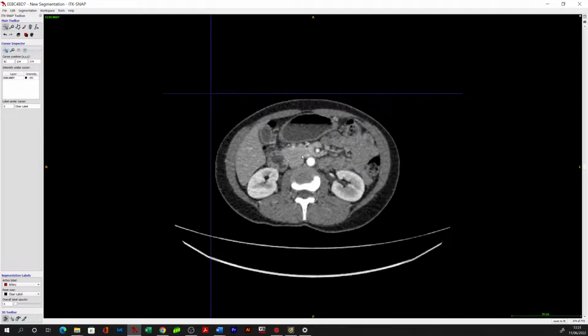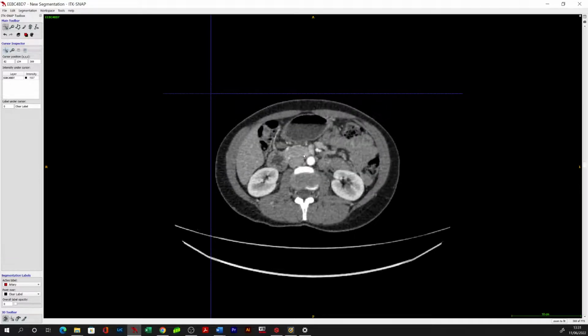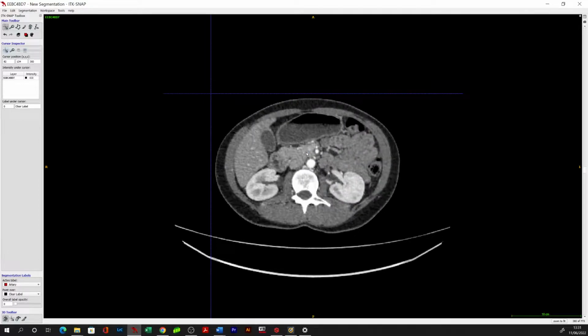I think that there is very likely a small pancreatic branch. But in all honesty, I think that the constituent vessels of Henle's in this situation will be GEV, SRCV, and ASPDV, which would be the typical configuration that you would expect. But this is quite a tricky case.